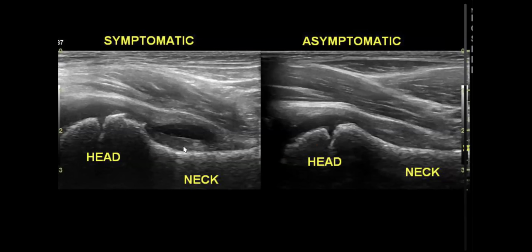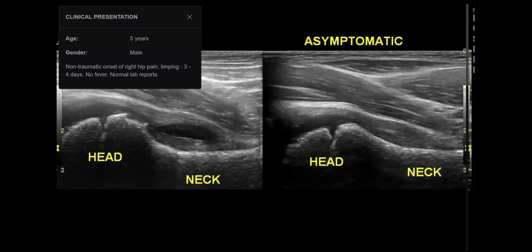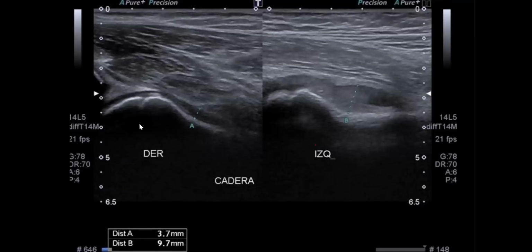If this fluid thickness with synovium is more than 3 millimeters, we consider it significant. Ignore this patient. A 5-year-old, normal labs, no fever. It's a case of transient synovitis. What about this patient?